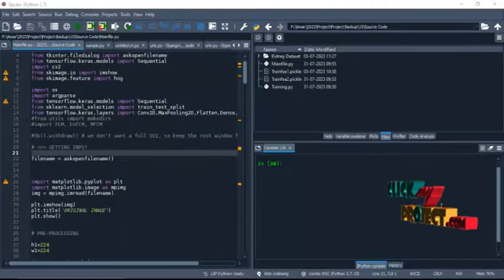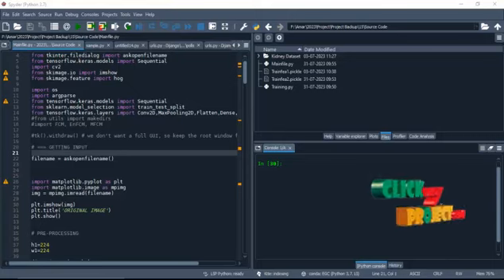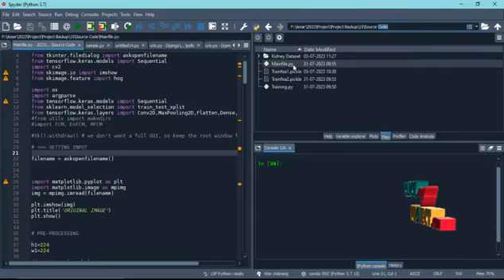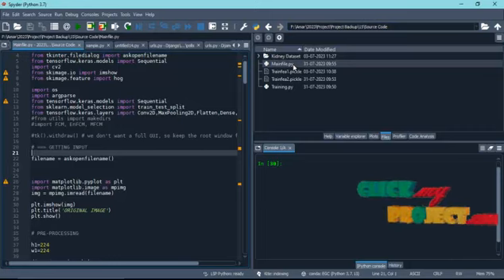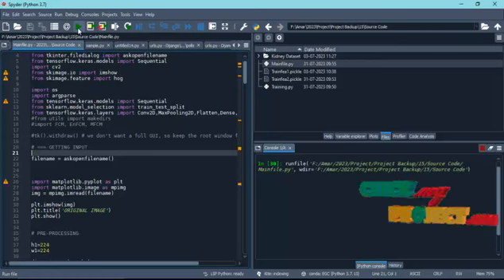Now we are going to discuss the running procedure of the project. At first, open Spyder 3.7. After that, you have to change the current directory like this. After changing the directory, we have to open the mainfile.py. This is the executable file. After opening the mainfile.py, we have to click the run button.